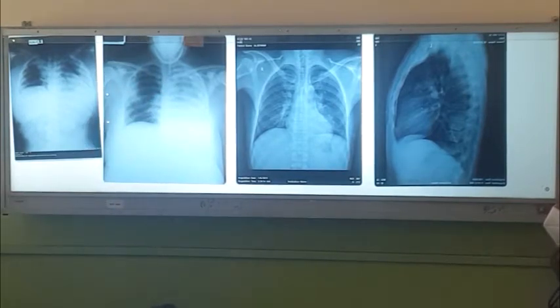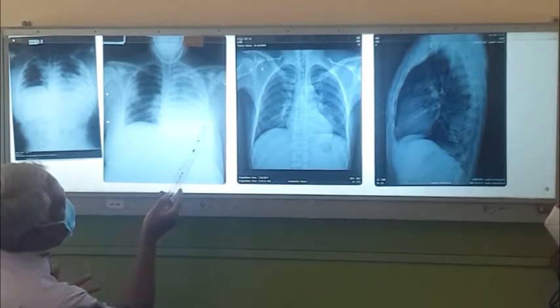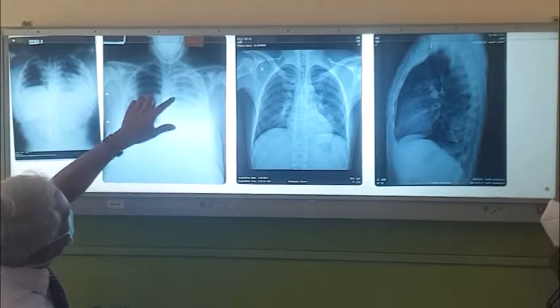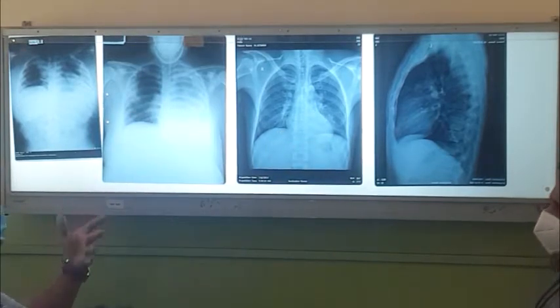And what you see here, now I can't see the cardiac shadow here, it has shifted there. I can see the descending aorta, I can't see the left hemidiaphragm. I can't demonstrate the normal anatomy there. So look for the normal anatomy. Like in this case, I can't see the left heart border, right? So normal anatomy is missing.